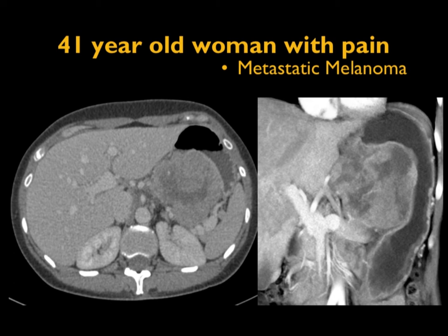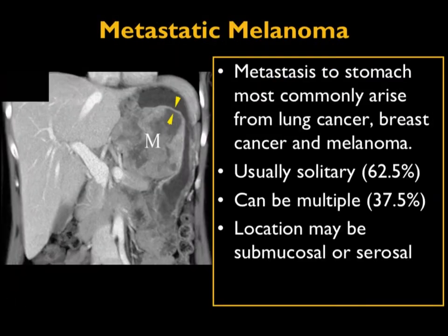And I probably thought that's what this was. This was biopsied. It was metastatic melanoma. Exophytic, large mass. Again, melanoma can be solitary or can be multiple. It can be small. It can be large. It can be submucosal or subserosal.